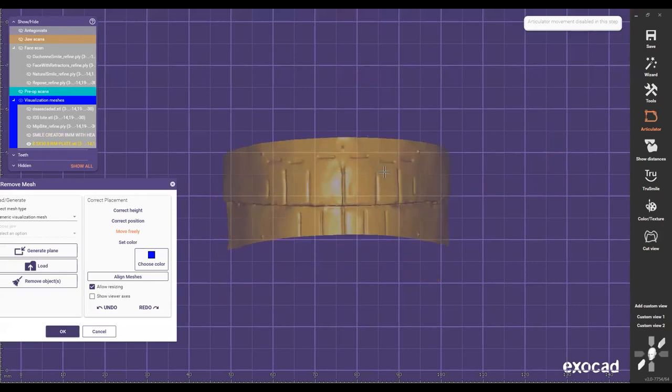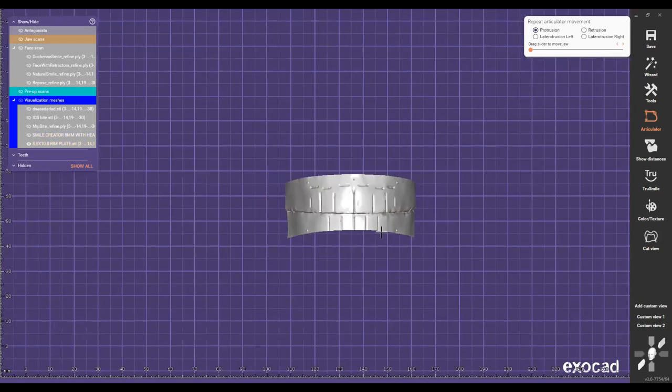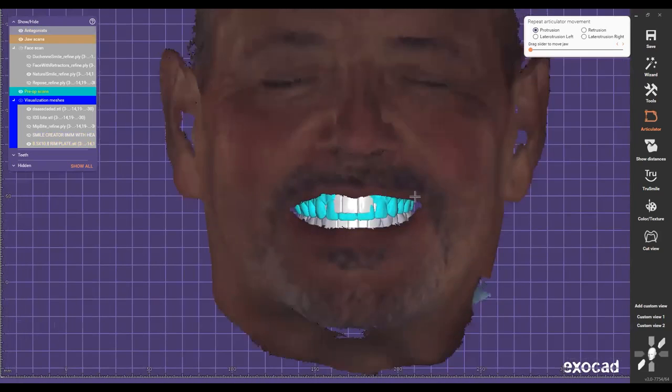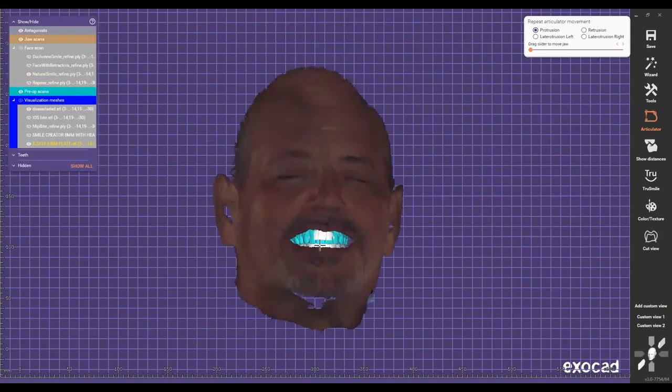So I'm gonna go and check this dot right here, and then just make my changes. Now everything matched to the background lines, so that tells me it's good. So now I can just come and say, okay, now I'm done. Everything is set, right? And these things are basically done in expert mode.